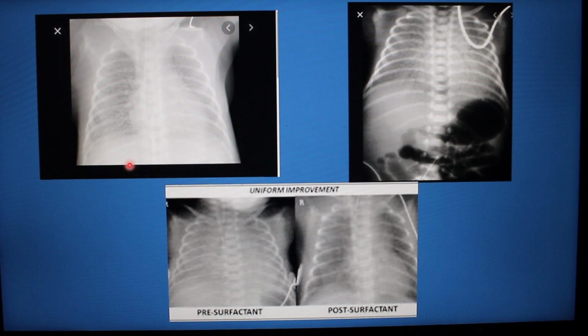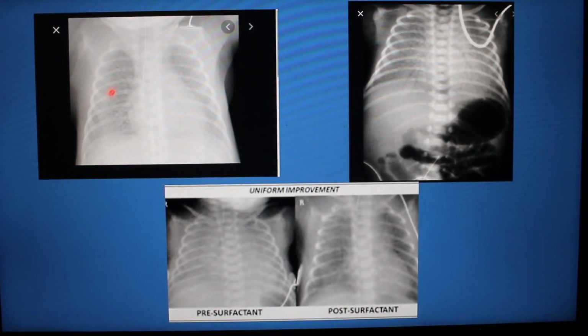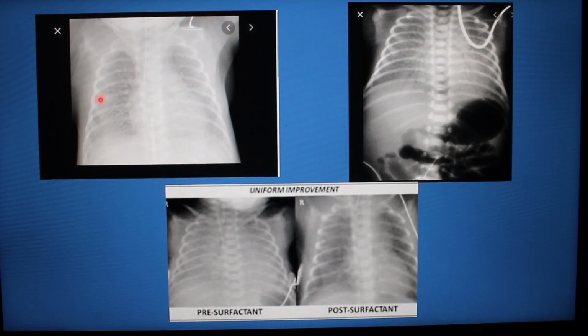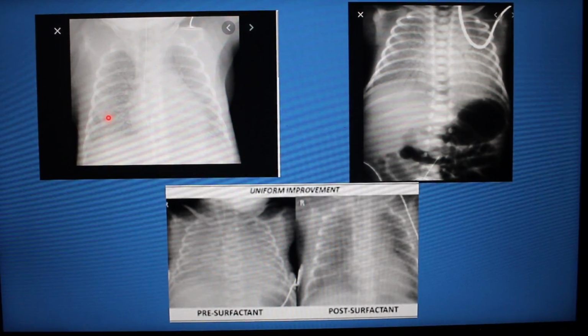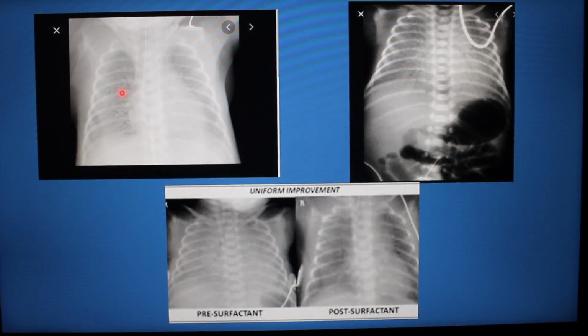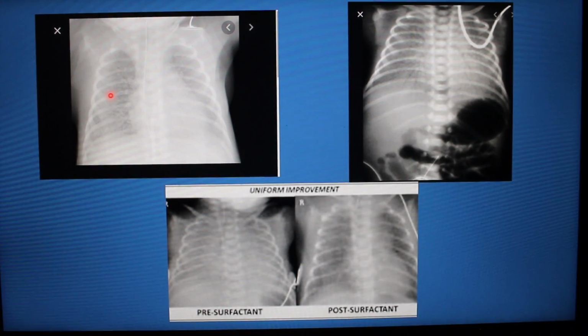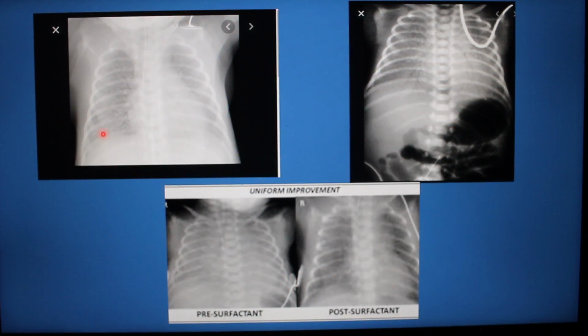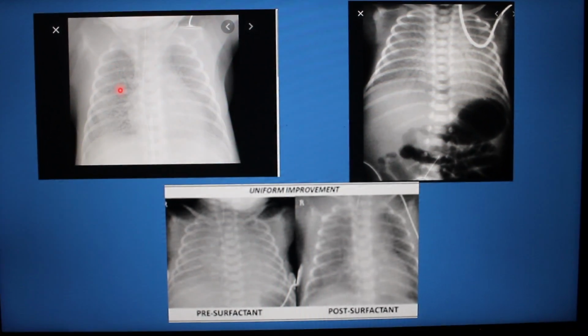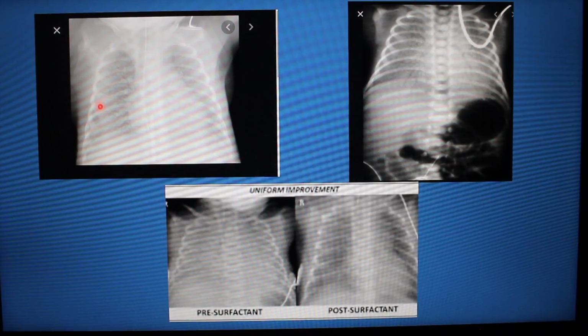Remember the X-rays that we had looked at before? This area of the lungs was nice and black. Well, now it's what we call whited out. All the alveoli are closed. They're not full of air. And you can see these black streaks within that white tissue. Those are the small bronchioles, the tubes that are full of air, and they're surrounded by collapsed tissue.